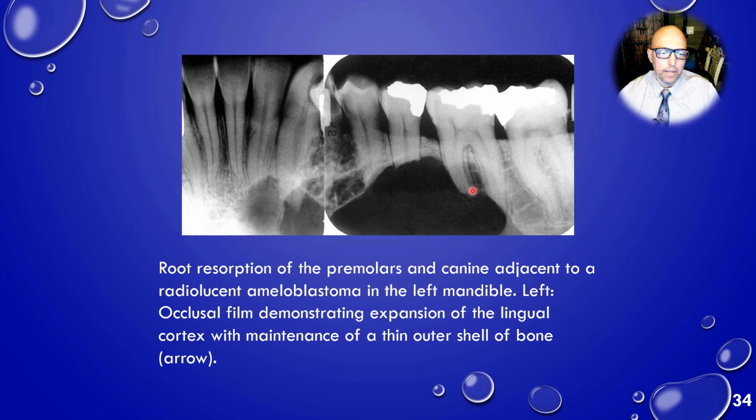And Ameloblastoma does have a high propensity to resorb teeth like this. A very straight across, benign type of resorption of roots. Resorption right there. That one looks like it remains intact, but well-defined corticated borders. Nothing about this looks concerning for malignancy. It looks like a benign tumor. Benign tumors tend to resorb even more than cysts do.